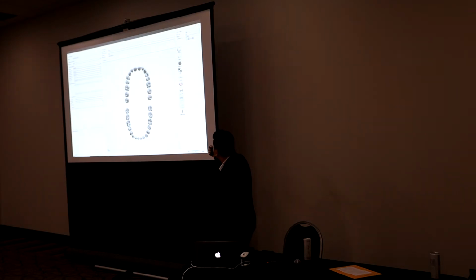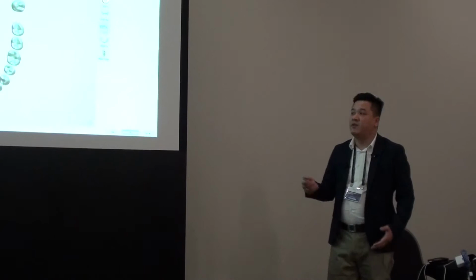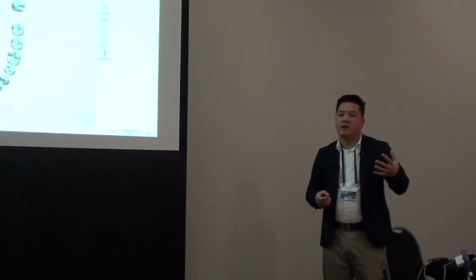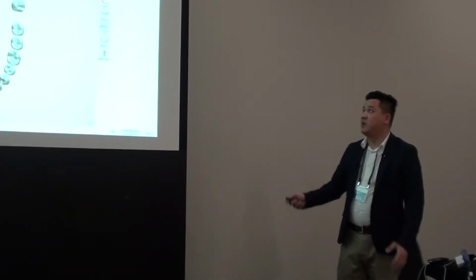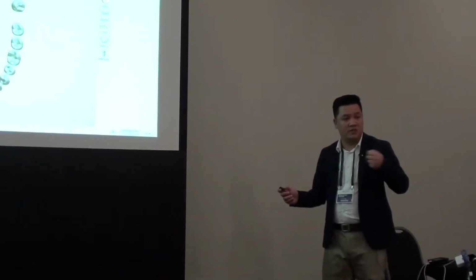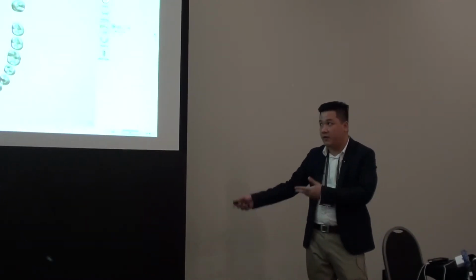And then what you're going to do, if you choose model, it won't allow you to choose this item here, which will allow you to build a model. And again, going back to variables, don't get hung up on the word object type and that it's a digital impression. If you scan this with a desktop scanner, still set it to digital impression because it's just a name and it's just a container. So for example, it could be called monkey for all we care, and this could be a banana. If the monkey wants a banana, we give it a banana, or we give it something that's fake that looks like a banana, and it'll allow it to pass, right?